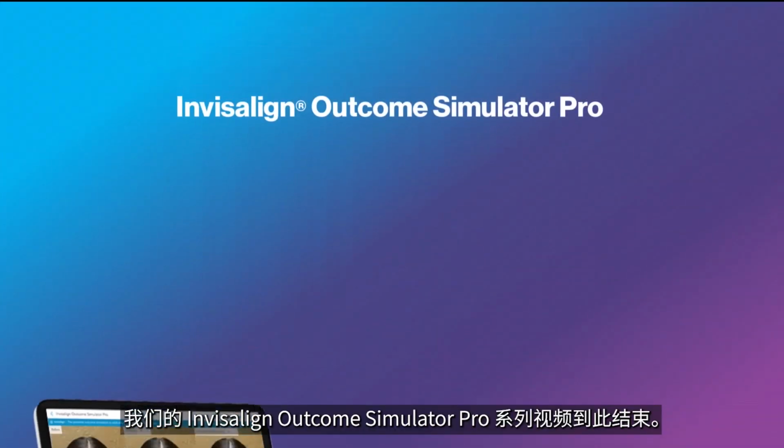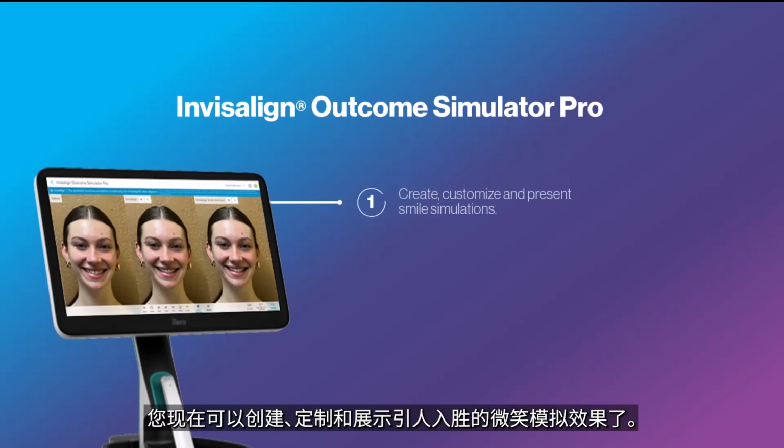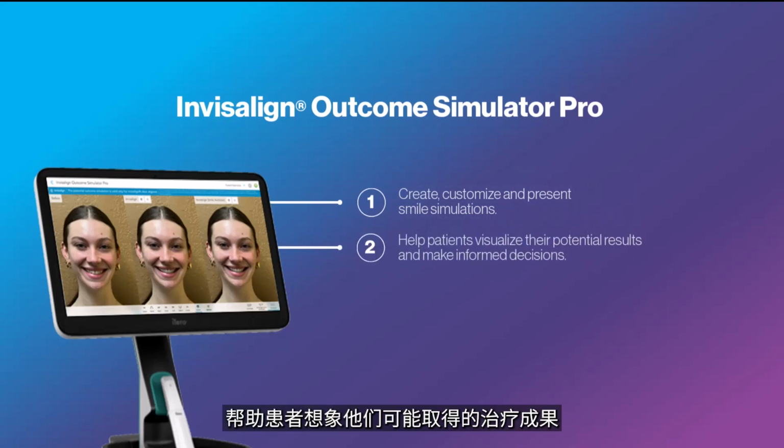This concludes our Invisalign Outcome Simulator Pro video series. You are now ready to create, customize, and present engaging smile simulations that help your patients visualize their potential results and make informed treatment decisions.